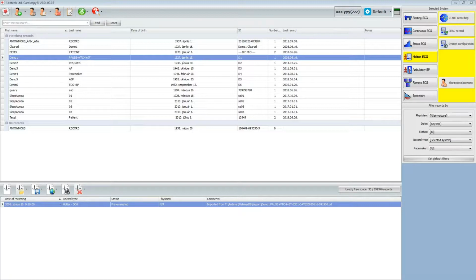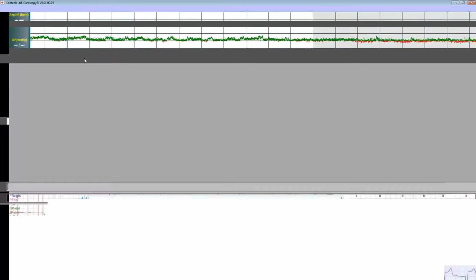I think I will start by demonstrating how the analyzing surface looks when you read a 24-hour record from a Holter device. I will use a demo record that you can also find on the CD that you get when you purchase a system from us. So after this webinar, you can also check this record by yourself.